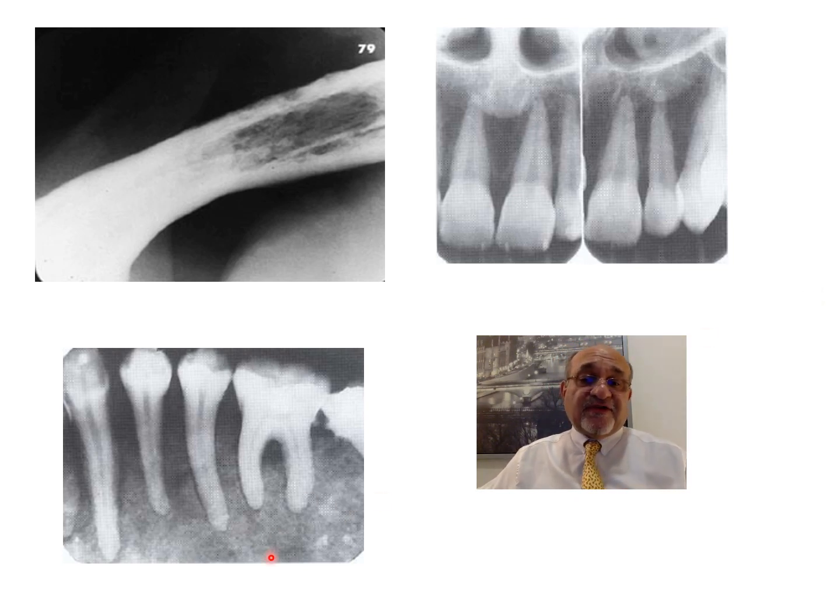Have a look at this area. No lamina dura. See the typical ground glass appearance. This is, as we said, typically because of the mobilization of calcium from the bone to the blood.